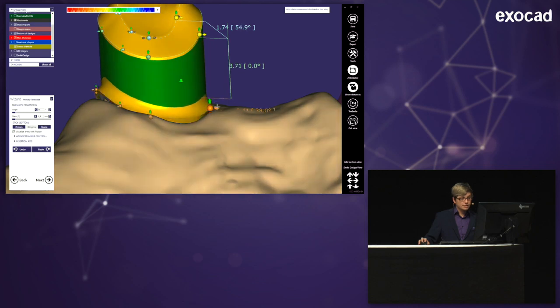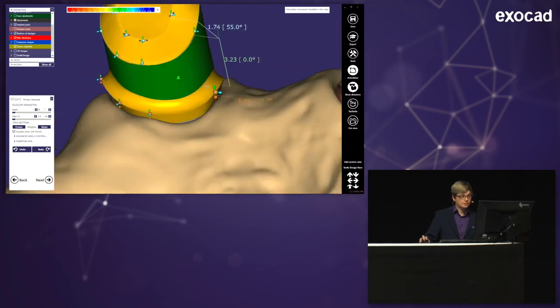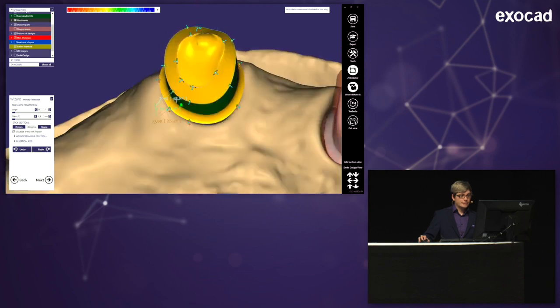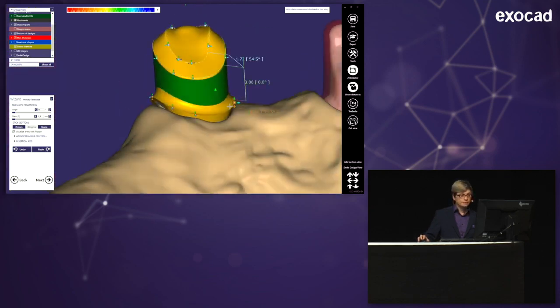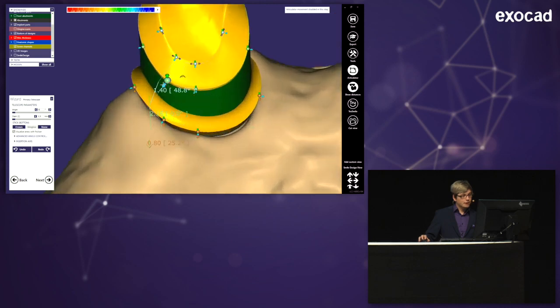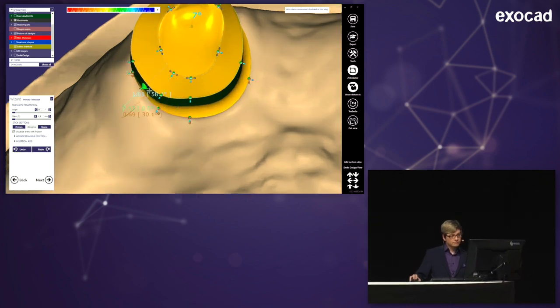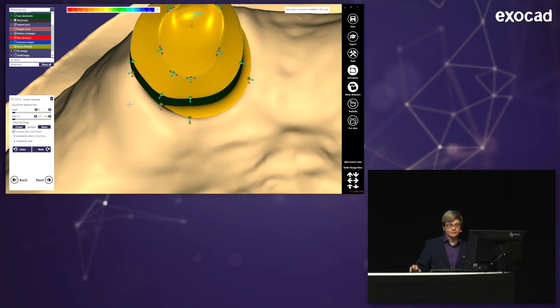And first, I pull out this border down here to secure my gingiva. And here, as always, using control, I can move all the points at the same time. And now, this will actually be the lower shoulder of the milled lingual. Now I'm pulling out some points here, 2 of them actually, to get a bit of a parallel or a plane surface here where I can place my attachment in the end.